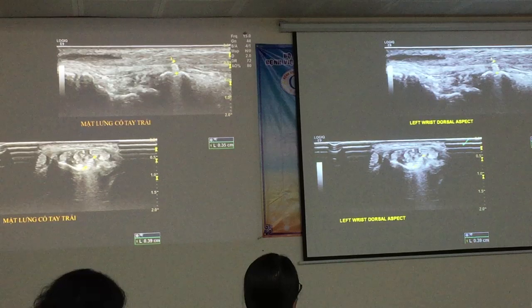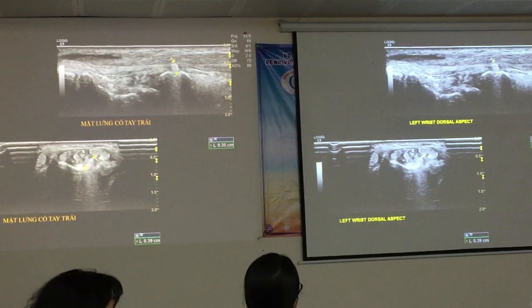So this lady was very grateful for her surgeon to get her wrist restored, but unfortunately, they didn't do a great job at measuring the screw length.